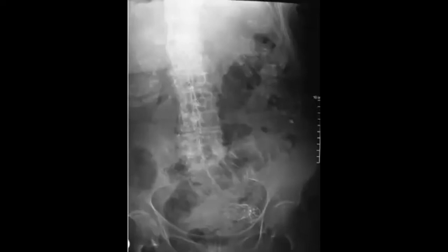So this patient is a 70 year old female patient who has a severe benign esophageal stricture, maybe due to acid reflux. And one day she had a history of abdominal pain and vomiting. Okay. So this request comes to you and you agree to do an abdominal X-ray, plain frontal radiograph of the abdomen. So what do you describe? What do you see?